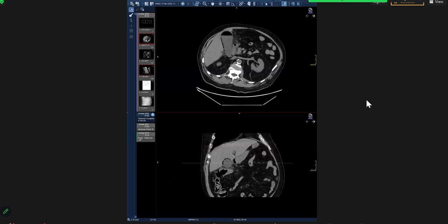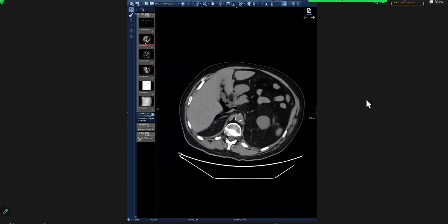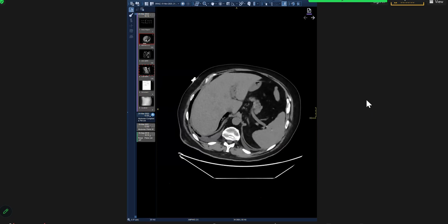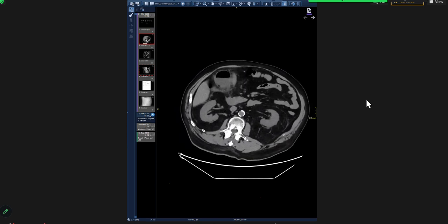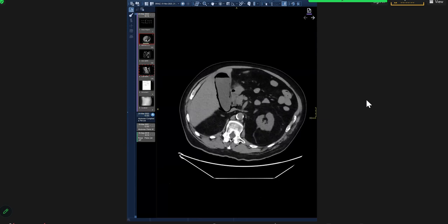Okay. CT scan abdomen, axial sections taken in the unenhanced phase of the same patient. In these images, I can appreciate air is noted in the gallbladder, in the wall of the gallbladder, and a few air loculi are also noted in the perihepatic space, in the subhepatic space. An air-fluid level is noted in the gallbladder. So I'm suspecting gangrenous gallbladder.